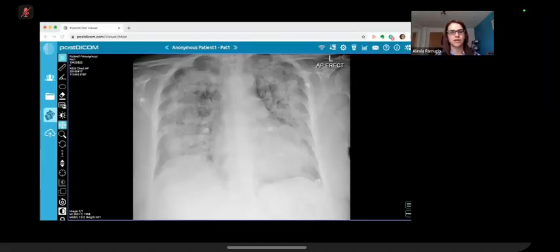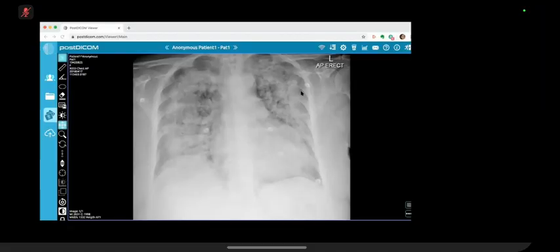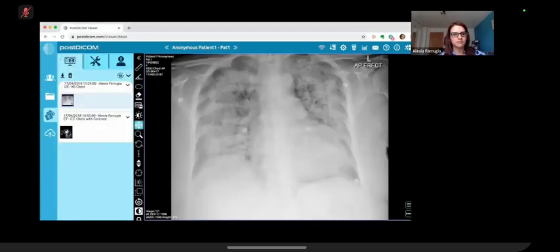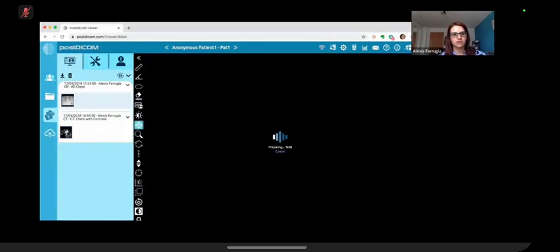So with lung infarcts, would you expect that peripheral sparing? You see that there's peripheral sparing here, so that would be quite unusual for pulmonary infarction. This is quite central, isn't it? Yeah. Okay, so I'll show you her CT. There's a CT with contrast for her.